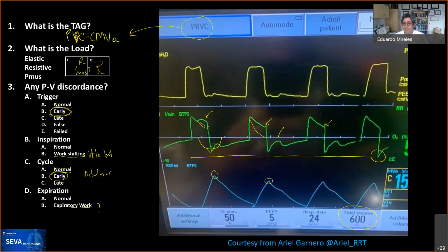That's the key of looking at these waveforms. And actually, if you start thinking about them, each breath has a clue for the next one, and you want consistency, and some of them have a little bit and a little bit more. So because of the first breath, Hara, that makes me think that what we're seeing is just reverse trigger, that it's a late early trigger or late reverse trigger, depending how you want to name it, but it's the exact same thing.